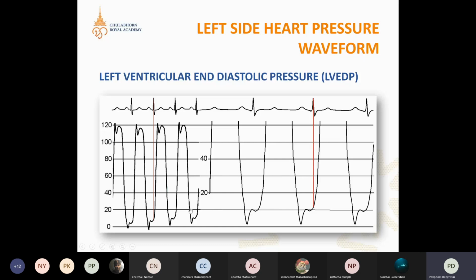Well, in the lab, if you see the LV pressure, maybe the doctor didn't intend to approach the LV, or did it by intention. After you can see the LV, you have to notify the doctor that the LV pressure is showing on the screen or something like that.